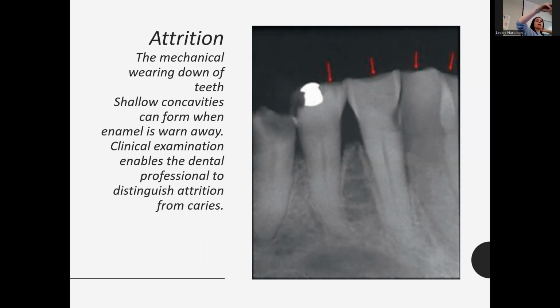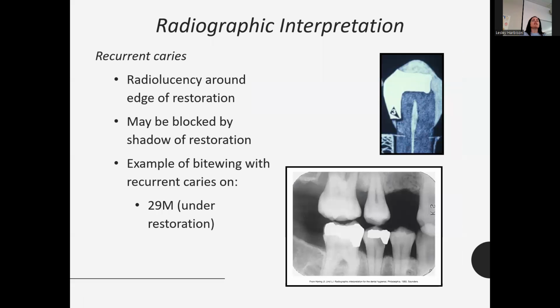In molars, it can be little circular areas that are scooped out, and on anterior teeth, it can be through the center here. So you can see how one, either buccal or lingual, is more shallow than the other, and it's more scooped out in the center of the tooth. But you'll see it right away clinically. That can often be from grinding, just heavy grinders. But food can also exacerbate it if they eat acidic stuff or have GERD, acid reflux, things like that.